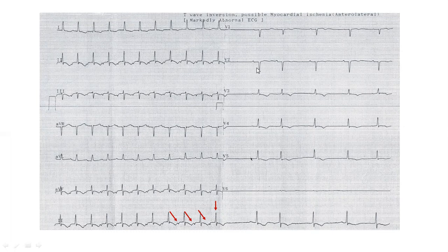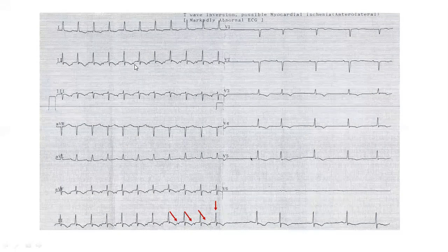So in sinus tachycardia, the P wave should look like a sinus P wave. It has to be positive in lead 2, 3, aVF, negative in aVR. How can a sinus tachycardia be negative in inferior leads? Common sense means common understanding of common things. Sinus beat P wave is always positive in lead 2, 3, aVF and negative in aVR.